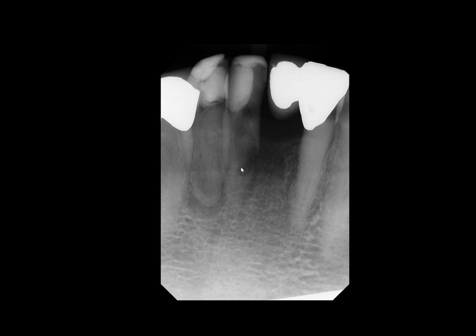We see a radiolucency that appears to involve 2/3 of the root at least, and it's extending toward the mesial root. I guess what I want to say is we see a radiolucency, but we are not quite sure the extent of this entity. Does it involve the pulpal space? Is it simply superimposed? Is this an expansion from the pulpal space, or is it something from outside going in to the tooth, right?